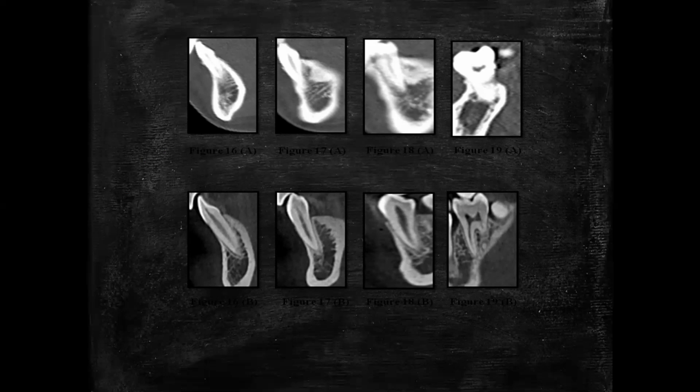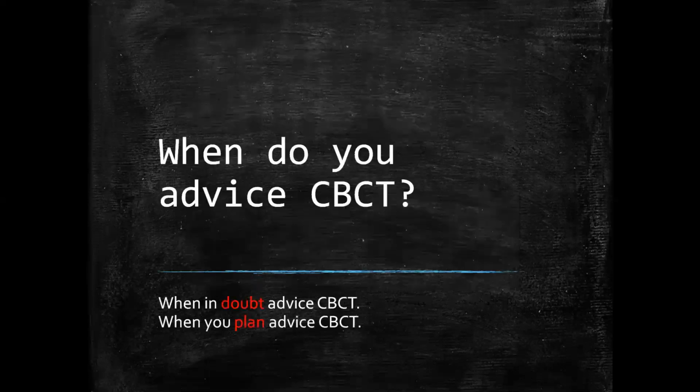You can't differentiate between dentine, enamel and pulp in CT scan, but you can very well differentiate them in a CBCT because of the different exposure parameters. Second, the small trabecular patterns are well appreciated in a CBCT. So I feel that compared to CT, CBCT plays an important role in dental practice and justifies its presence.